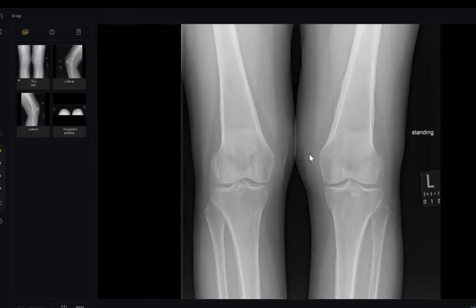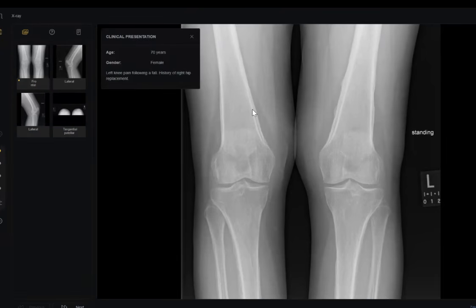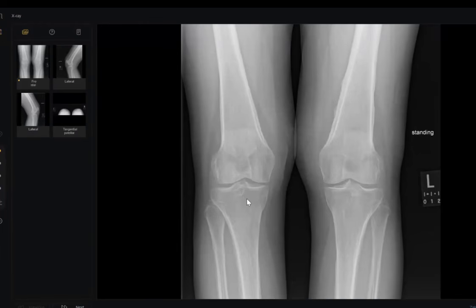Don't talk about thyroid acropathy at all, especially as the patient is 70. Okay? 70. This is number one. Number two, thyroid acropathy means hand with soft tissue and fluffy periosteal reaction. It is another scenario. This is the first very important point here.